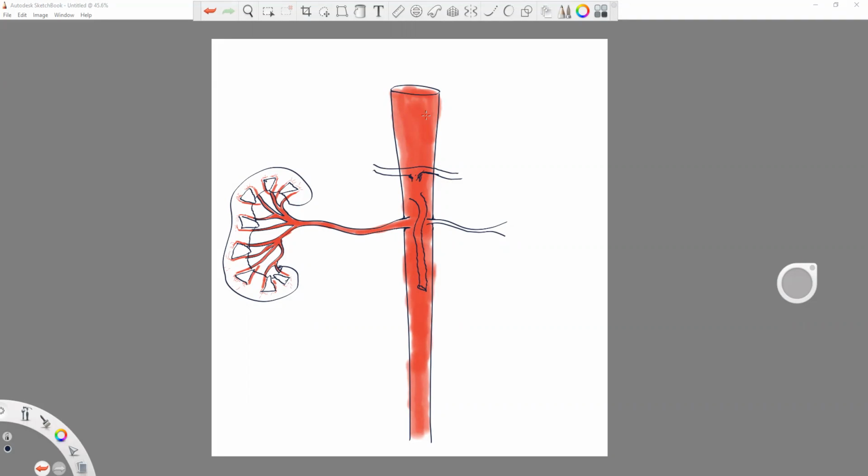Quick note though, and I know I've said this before, but just as a reminder, it's not a billable Doppler exam unless you do a renal artery and a vein. So on this exam, it's artery, artery, artery, artery. All you need is one good sampling of a renal vein leaving the kidney, and that's it.